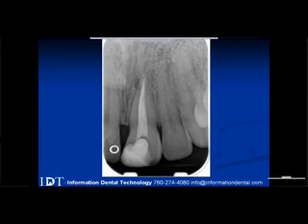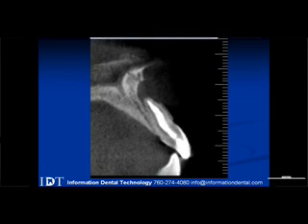They took a periapical, there's a slight radiolucent area on the apex side, on that mesial apex side. It doesn't extend over the apex. So most people said, we'll just monitor it, leave it alone, it's really small. The same day, same patient, a CT scan was taken, and there was significant buccal bone loss on the facial. It's just at the coronal level, there was some left on there.